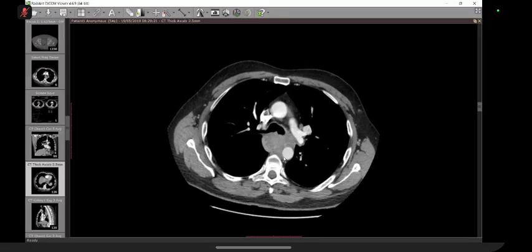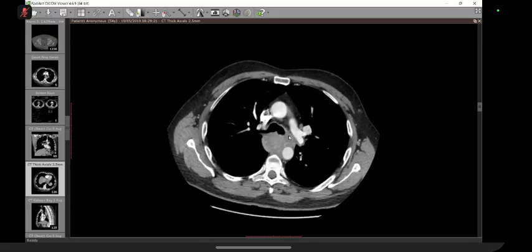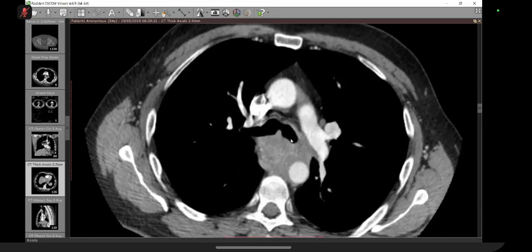So look at this tumor. Now, just on this slice, what do you think? What do you think about the left main bronchus? Invaded? What are the signs? The signs are that it is displaced anteriorly. One can argue that you can actually see a bit of it projecting here, but I'll show you a sagittal for this also.